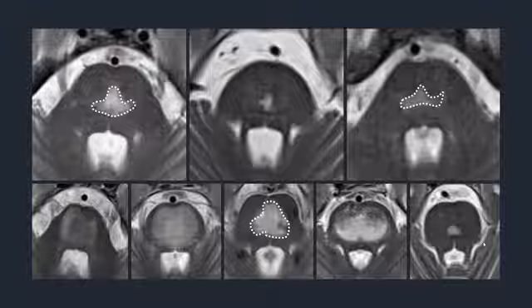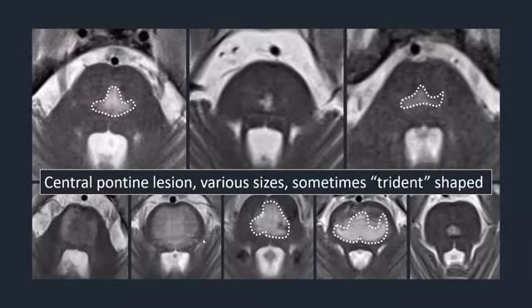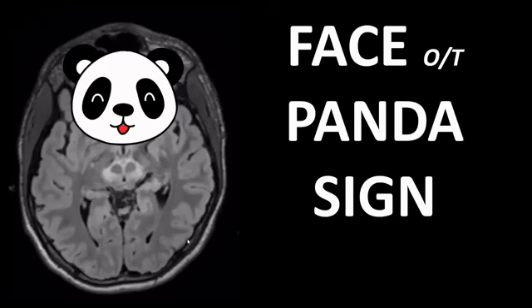In all other cases, these were also cases of osmotic demyelination. You can't recognize these entities, so keep that in mind. So we have an osmotic demyelination lesion. In osmotic demyelination syndrome, we can sometimes recognize these signs, but sometimes they are not even present.